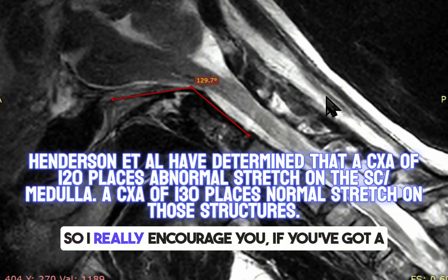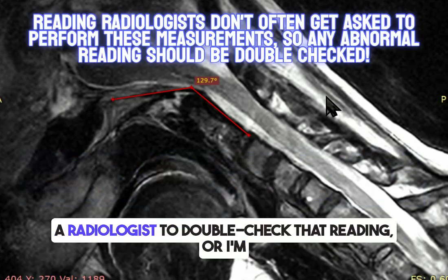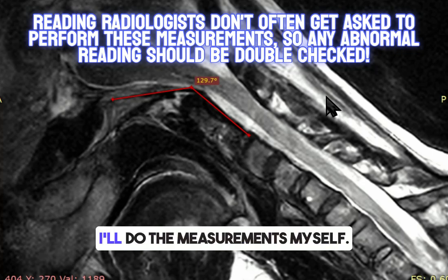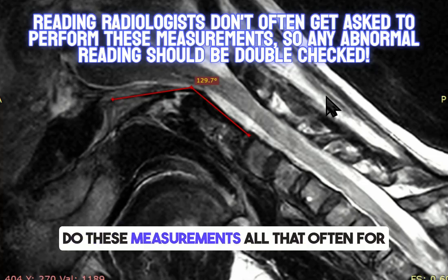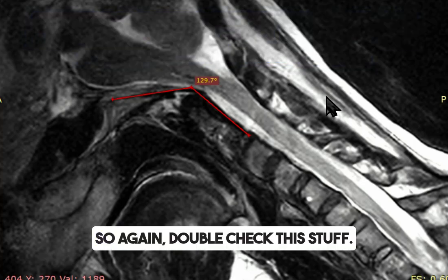So I really encourage you, if you've got a craniocervical instability patient, you get an anomalous reading from a radiologist, to double check that reading, or I'm happy to take a look at it as well. Just send me an email and I'll do the measurements myself. But it's not uncommon, since radiologists don't do these measurements all that often, for them to get them wrong. So again, double check this stuff.